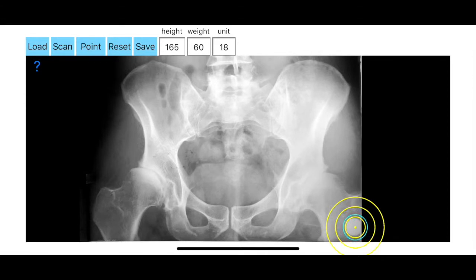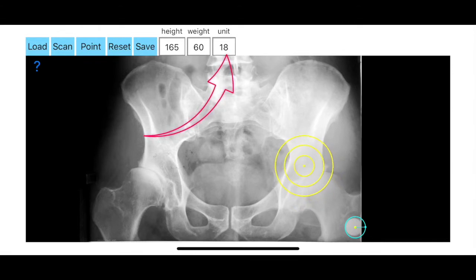Next a dynamic circle appears with the C1 center point marked over the screen. The radius of the circle is changed dynamically, and by moving the attached finger you try to find the best fit circle to the contour of the coin. Once you have found the best fit you press the point button and the whole coin is marked by the circle R2 point. If the coin for example is 10 mm you enter the number 10 in the box.